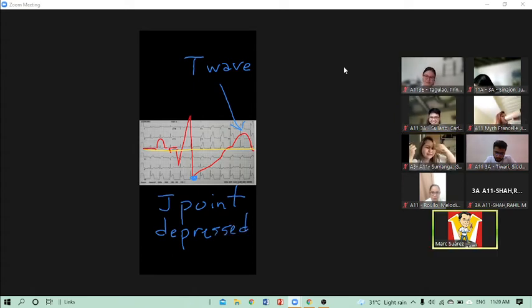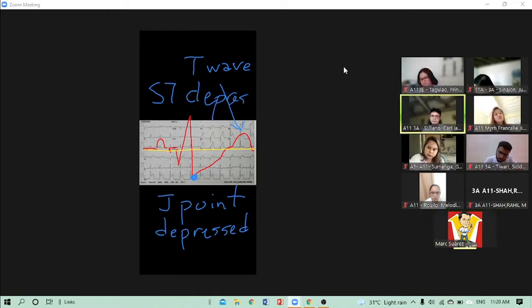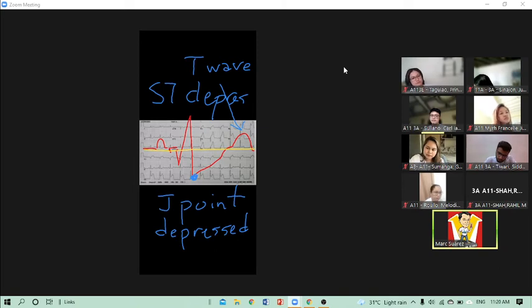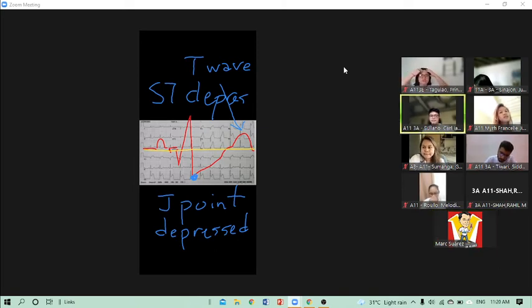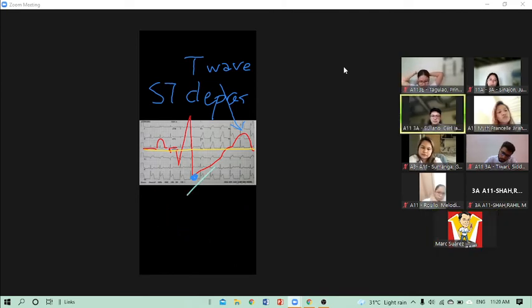So this is how a typical ST segment depression would appear. Is this clear? Are there any questions? Shall we proceed? Let's proceed, Doc.